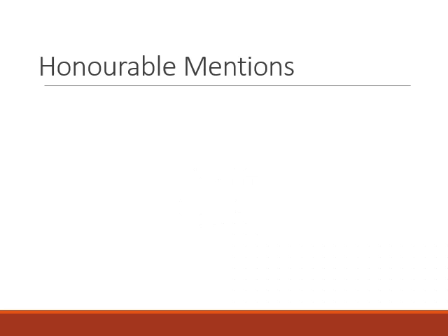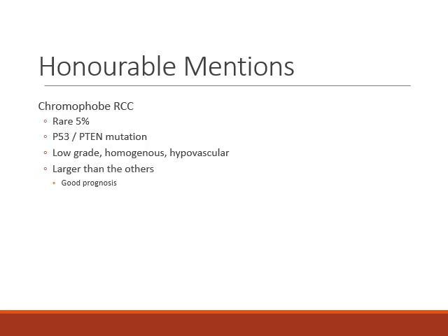There are two more I have to mention. Chromophobe RCC is rare but generally has a better prognosis than the previous two. Tends to be a bit bigger, around 7 centimeters, and can show a central stellate scar and spoke wheel enhancement. But the key here is there are no imaging features that are characteristic. So these are diagnosed on histology after the lesion has been resected.